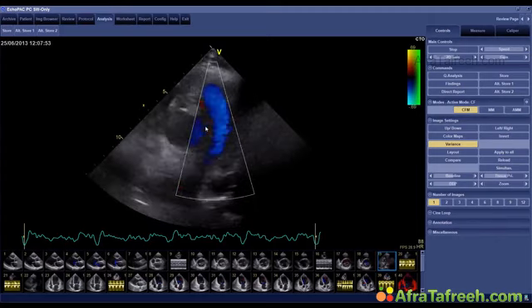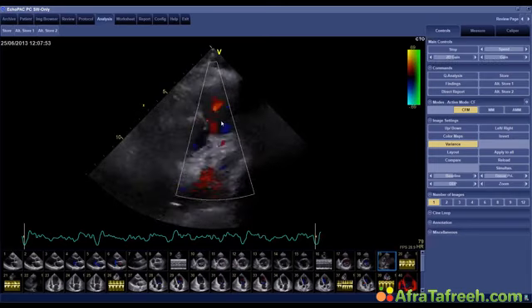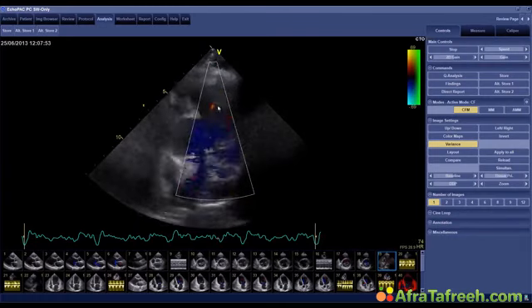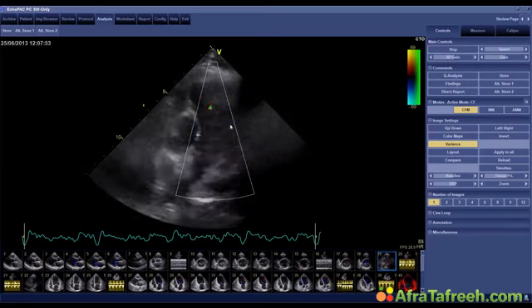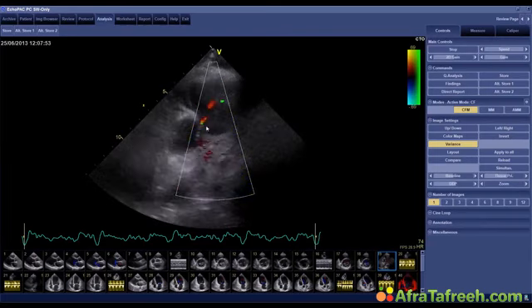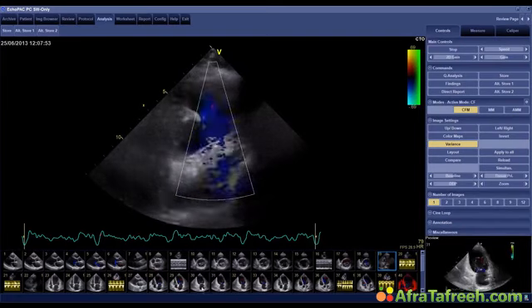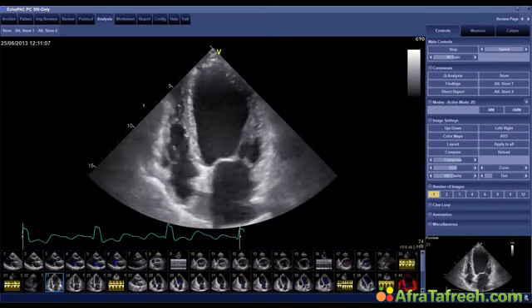People think that is some kind of aortic pulmonary window or some shunt between the aorta and the pulmonary artery, which it obviously isn't. You have to imagine the pulmonary valve is not really flat, but has kind of a doming appearance, and this is one portion of the valve which is just on the rim, and that is where the jet originates. So this is certainly not anything pathologic, but it's just a second jet of PR. Okay, but let's go back to the case.